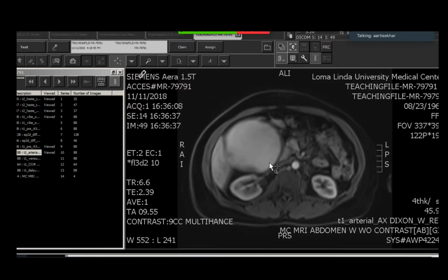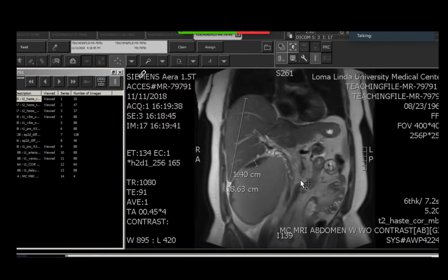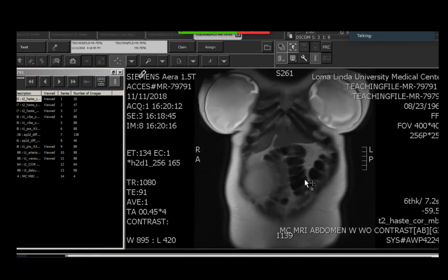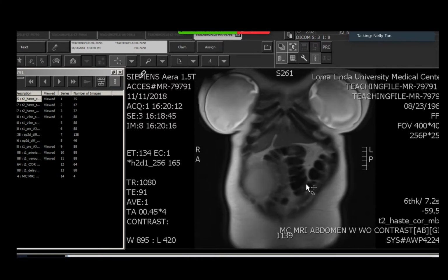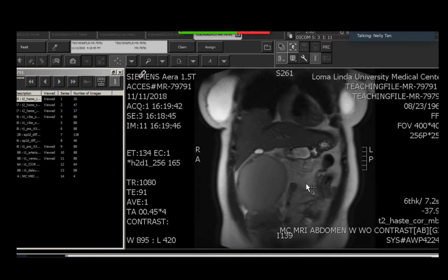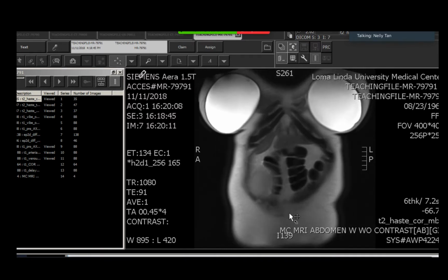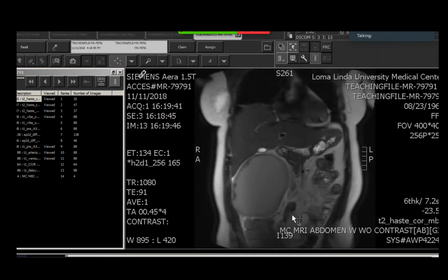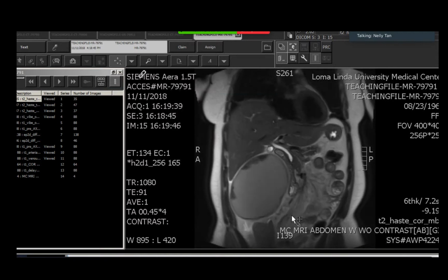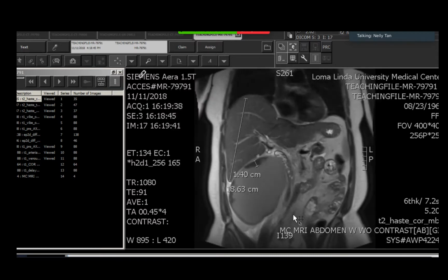So, that's a good question. I don't remember. Maybe we can find it. Mucocele was raised as a DDX, but I don't remember if I saw the appendix or not. So I think this is the TI. Is it the TI? Okay. The patient got resected, and it wasn't an appendix, but I don't see an appendix either. I don't know if you guys do or not.